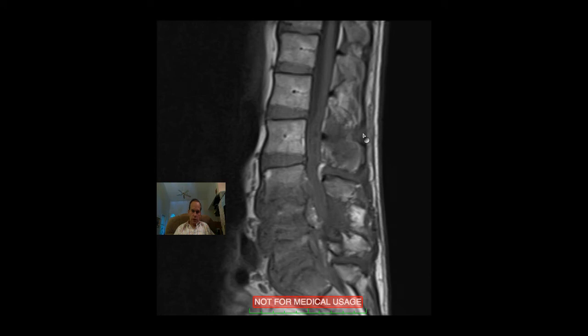Here's an MRI again showing the severe degenerative end plate changes. This is a T1 weighted sequence. So we're getting a little bright signal in the vertebral body related to the fat in the marrow, but that's obliterated by the severe degenerative disc disease and end plate changes at the inferior L3 level and superior and inferior L4 levels, and to a lesser extent the superior and inferior L5 levels.